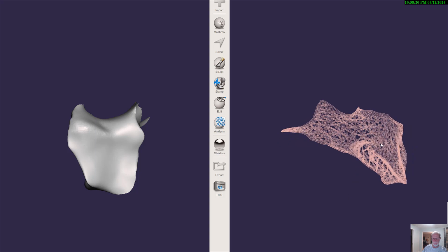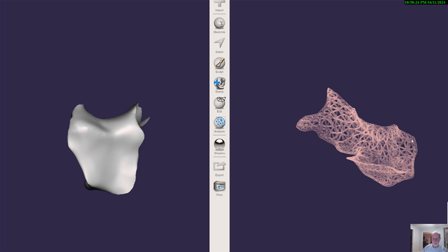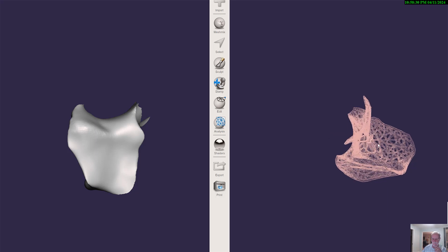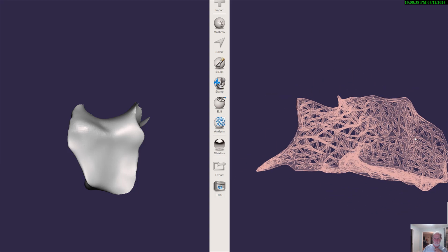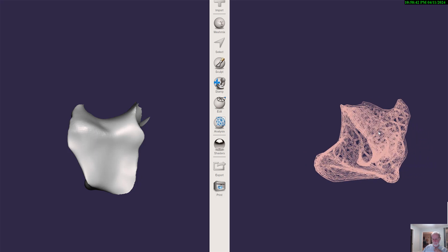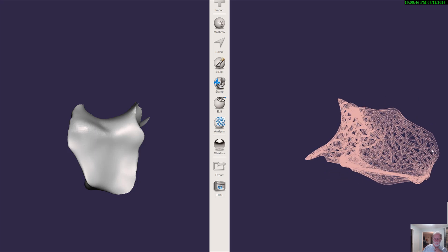We can also, where there is contact between the soft tissues and this lattice, make the triangles even smaller, in order to avoid soft tissue invasion. And where the bone is actually contacting the bone graft directly, we can make them a little bit wider to let the blood vessels invade the bone graft.